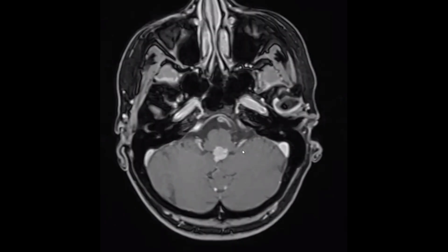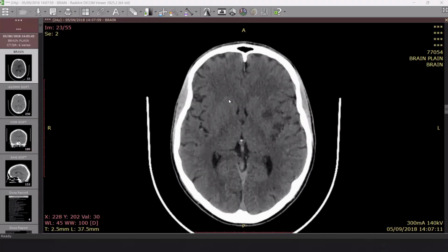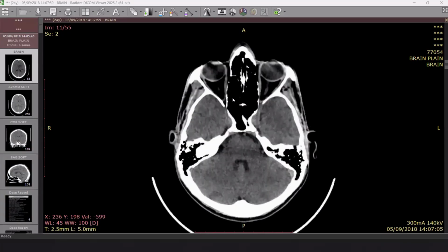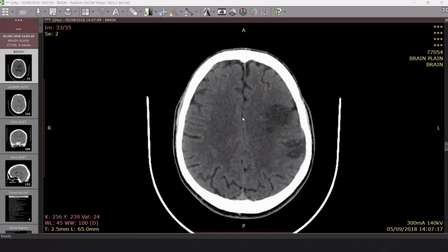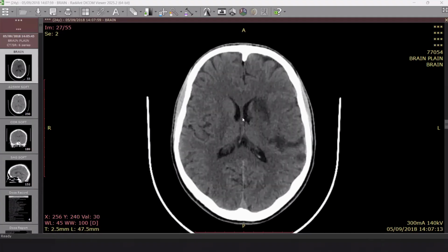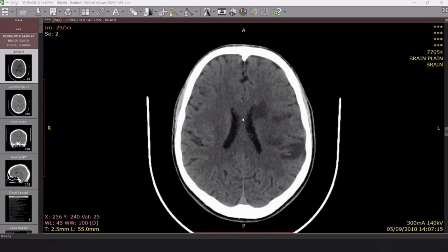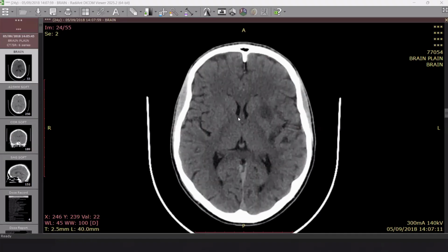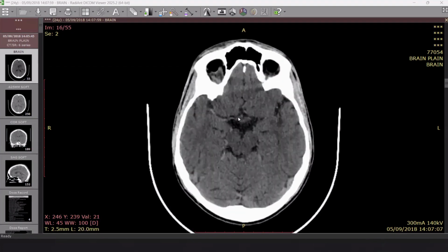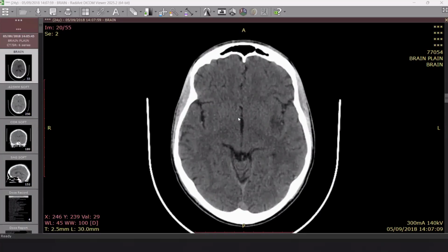Thank you so much. Do we have any other candidates? Anyone who wants to share with me? Yes, I can. Okay, go on. We have right-sided hemiparesis. This is one of the most common findings. I have many cases like this, but we need to apply something very important in this case. Right-sided hemiparesis, what do you think? Do you want me to scroll or do you want to scroll by yourself? Yes, doctor, I can scroll. Okay, go on.